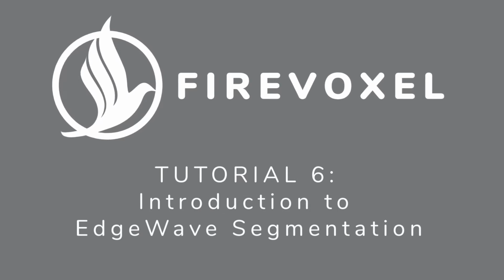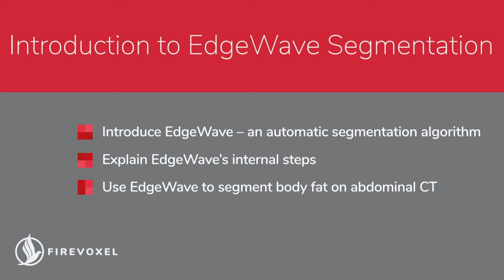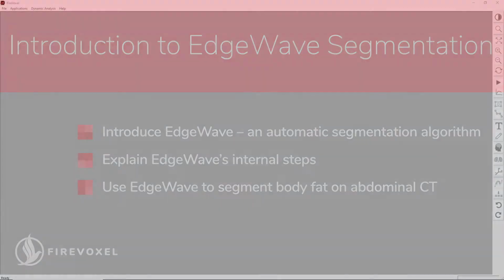In this tutorial, we will introduce EdgeWave, an automatic segmentation algorithm. We will first explain the internal steps of this algorithm. Then we will demonstrate several different ways to use EdgeWave. As an example, we will measure the body fat composition on abdominal CT.